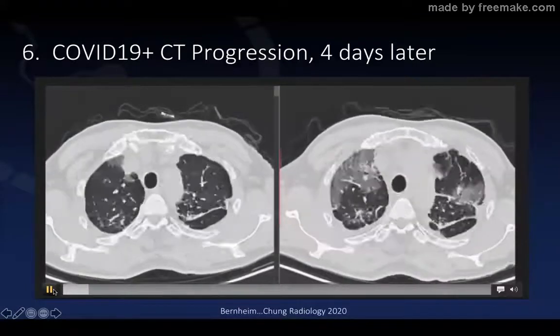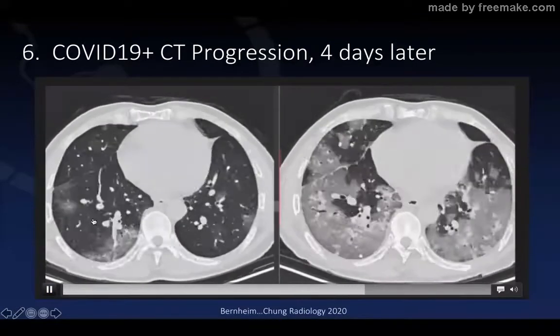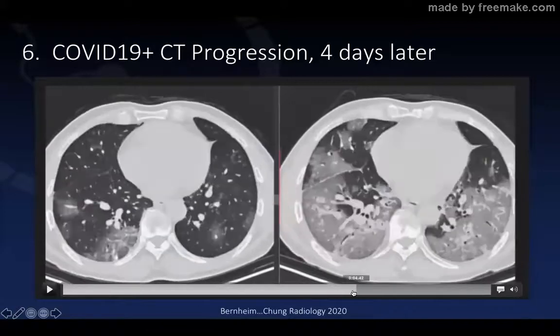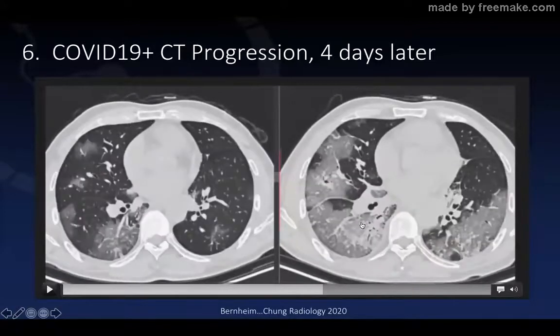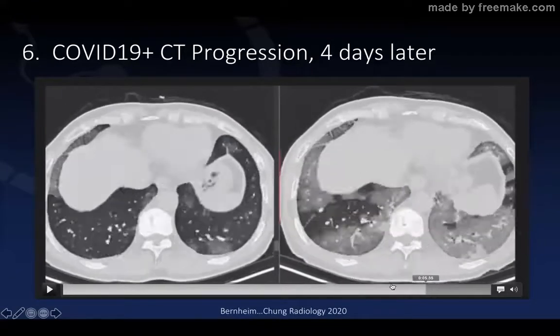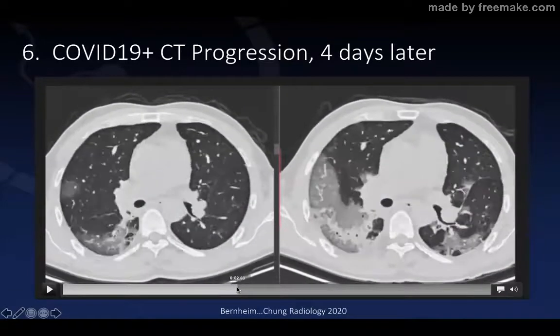And here in the lung apices, there are changes of chronic granulomatous disease. And 4 days from the initial CT, one can see increase in extent of ground glass and areas of emerging consolidation here. Again, evolving, increasing findings of pulmonary opacification here, again, in a very basilar predominant and also peripheral pattern of patchy pulmonary opacifications.